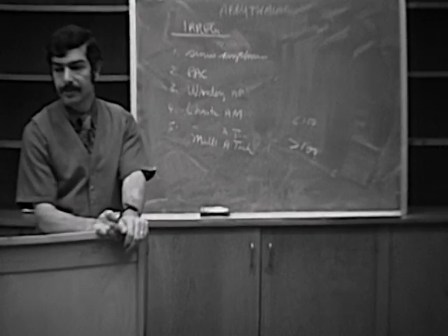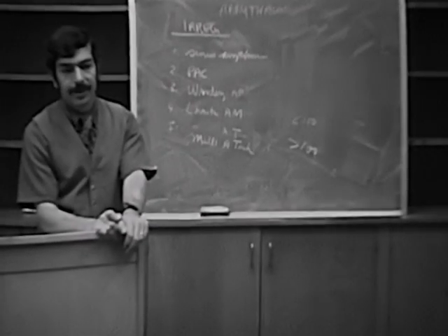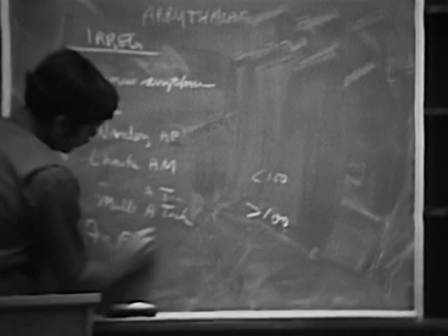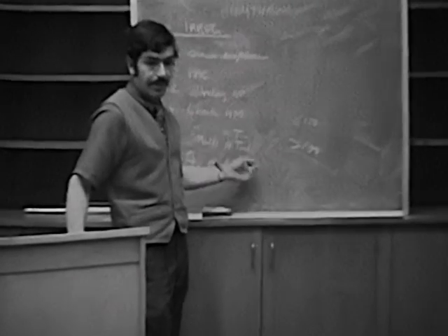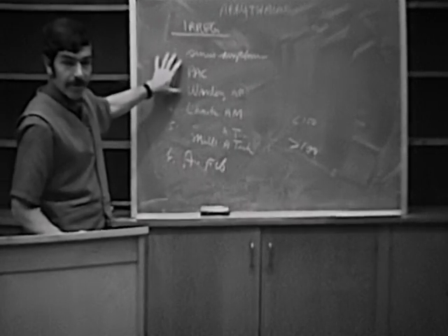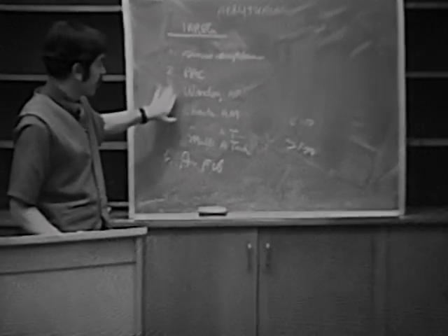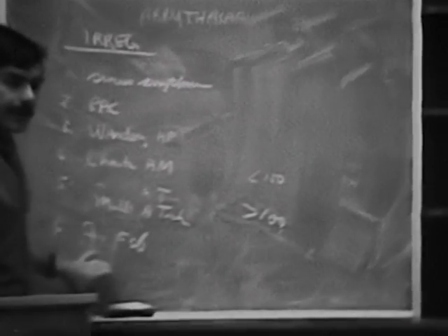Any questions about that? Chaotic atrial tachycardia. Multifocal atrial tach. There's been quite a bit written on this. I can refer you to some articles if you're interested in hearing more about it. And then finally, atrial fibrillation. Multifocal atrial tach is a pre-fibrillatory rhythm, and these patients frequently then wind up in atrial fibrillation. Okay, so if you're just looking back over the big picture here, this is just the spectrum of atrial irritability, right? From least irritable to occasional PACs, wandering atrial pacemaker, chaotic atrial mechanism, to the tachycardia, and then on to atrial fibrillation.